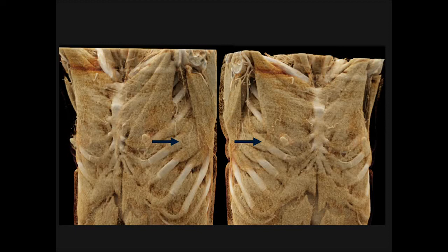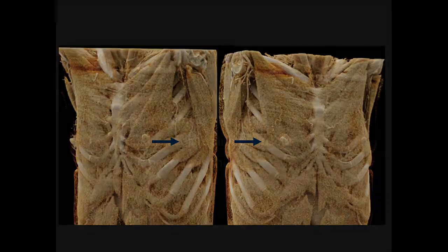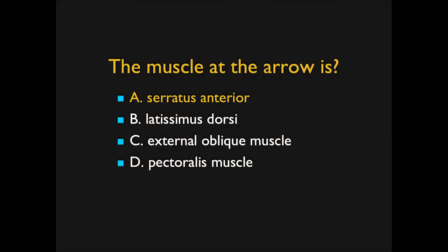And in trauma, you can see injury to the serratus anterior. There was just a football player, I forgot from what team recently, who had an insertion of the serratus disrupted, and now they can't throw. So it's important, particularly if you're the radiologist for a football team.